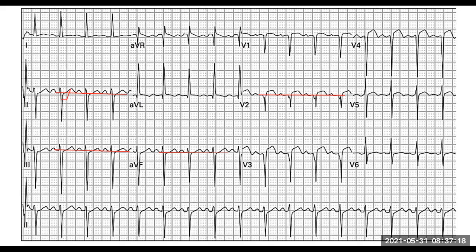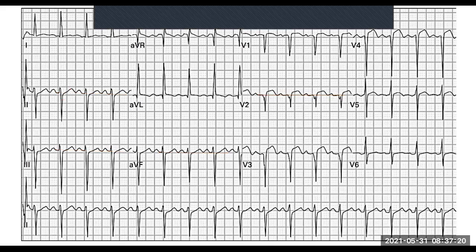And then the last thing we need to look at is the right side of the heart, or AVR. Do we notice anything over there? Yeah, not really. Okay, it's kind of within normal. But where's the problem now? What did we say when we want to diagnose a myocardial infarction? You guys should remember this. If you've got ST elevation somewhere, there should be something else that you should see.